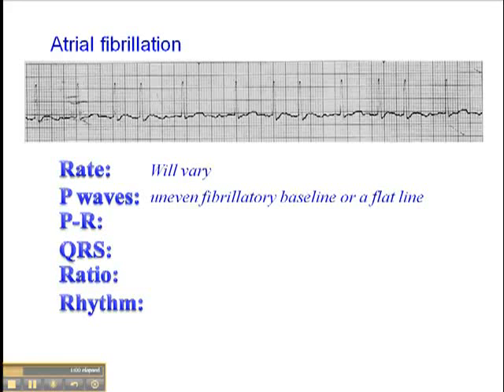And P waves are absent. And what you may see in the place of P waves are an uneven fibrillatory baseline or a flat line. And I wouldn't use the baseline. You can see here is a very uneven baseline.